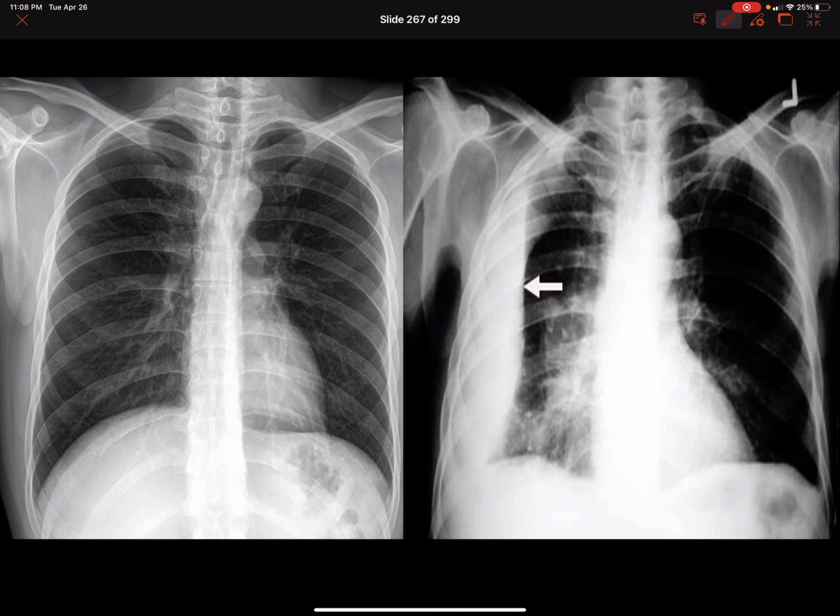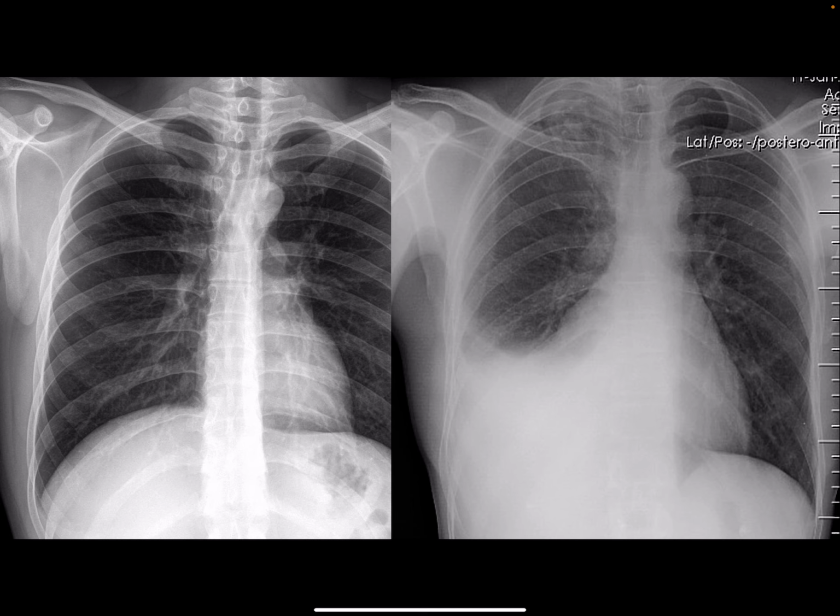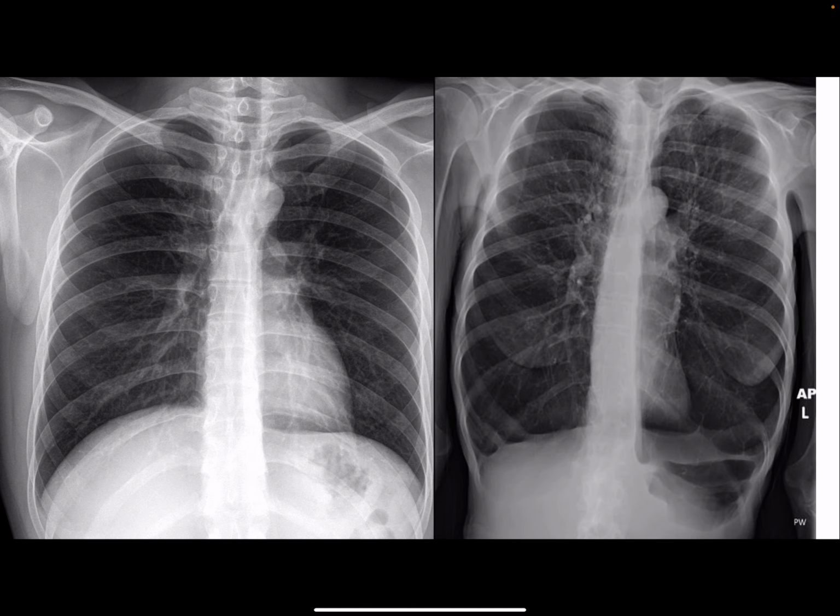So this is probably a pleural effusion. Pleural because it's on the periphery and it's just so opaque that it couldn't be anything other than just massive amounts of fluid. They're probably lying on their right side, which is my guess for why it's pushed over to there. I don't know, maybe it's pinned up for some reason as well. This, I'm guessing, is just a pleural effusion, but someone's laying down, or gravity is now bringing this down to the inferior portion of the lung.